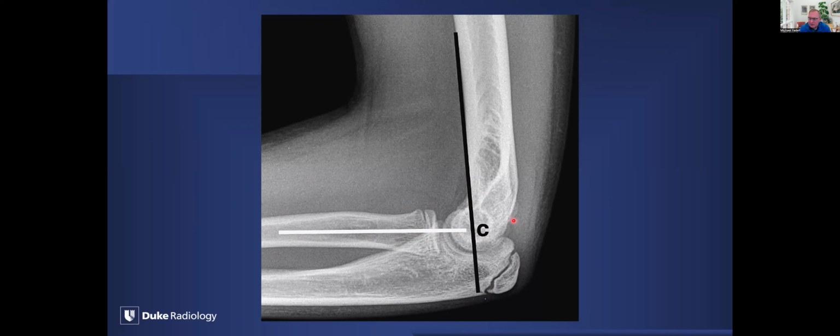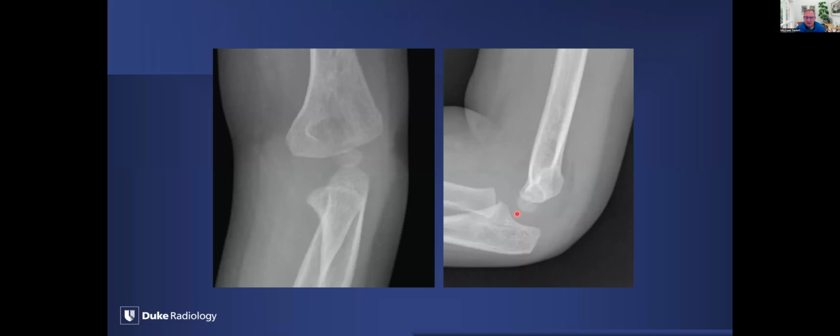One of the structures we saw before happens to be this medial epicondylar ossification center. We can just see that on this lateral view pooching out there. So here, what do we have? Well, we have our elevation of the anterior fat pad. We have our elevation of the posterior fat pad. So we've got a joint effusion. Again, here's the joint capsule here.